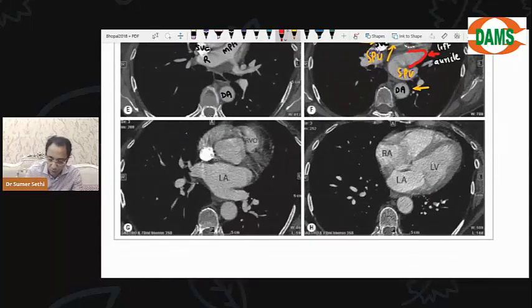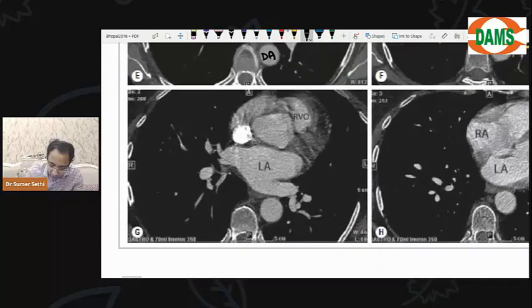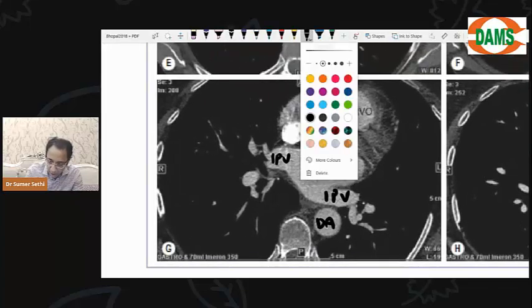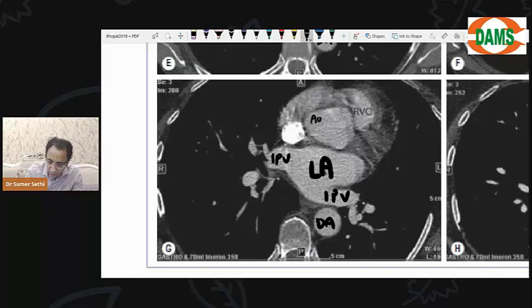So this is the end now. This is right next to your vertebra. You have the descending aorta. The posterior most chamber of the heart is the left atrium. These are your inferior pulmonary veins. The dilated part in the center is the aortic root.